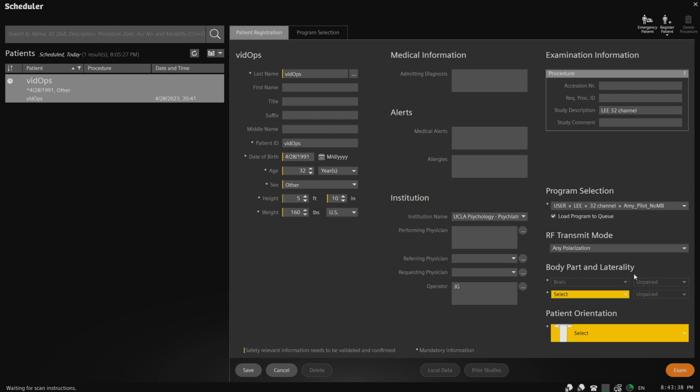So because this system is brand new, it doesn't auto-populate all of the DICOM server directories yet. So when you scan your very first scan on the system, you'll have to type in the exact DICOM path where your data is going to go. And then from then on, it will auto-populate. I'm going to put nothing, because it's going to go to the unknown folder. No one really wants this test data.